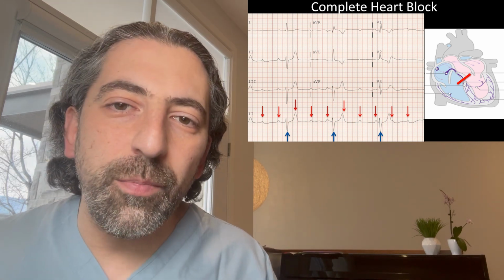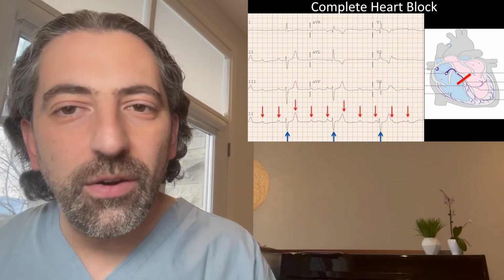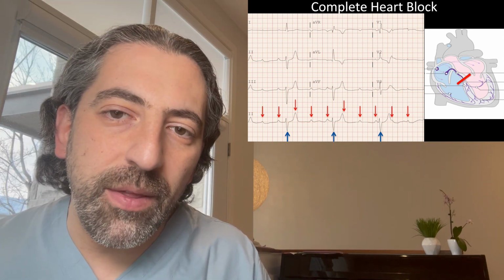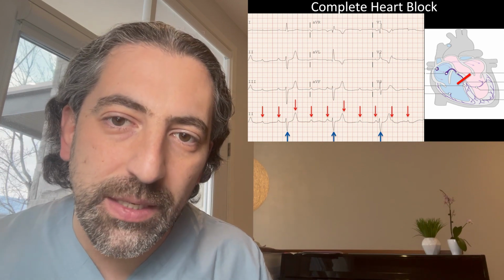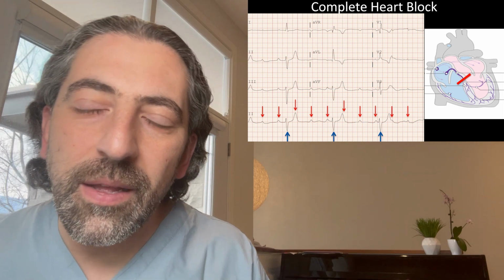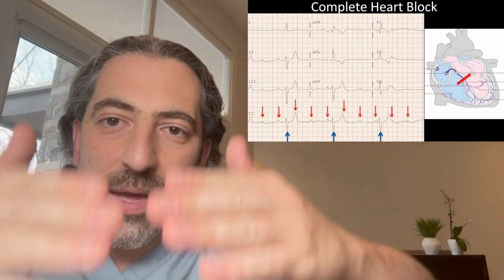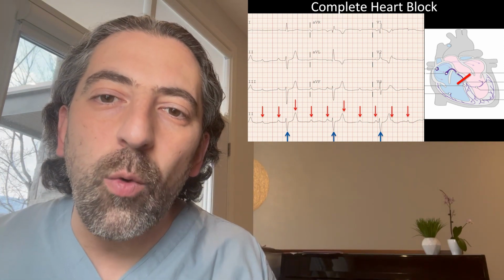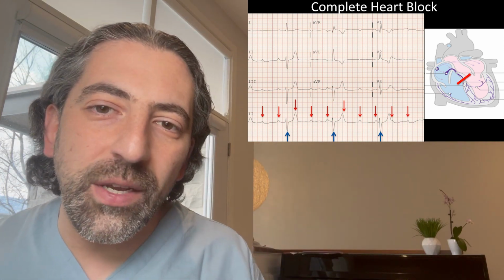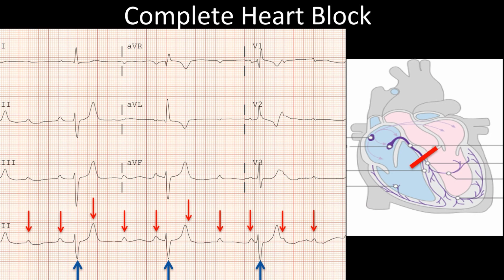And usually the patient will present to hospital with a very slow heart rate, with symptoms of either presyncope or syncope. And because this escape rhythm is originating from the His-Purkinje system below the AV node, so either the left bundle or the right bundle system, or from ventricular myocardium, and is not following the normal conduction pattern through the AV node, you're going to get a wide QRS. So these ventricular escape rhythms are usually wide, as in these examples that we showed.